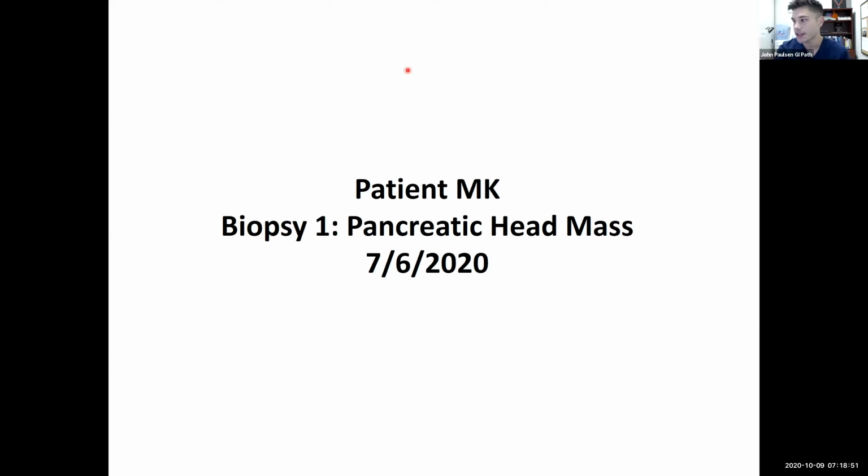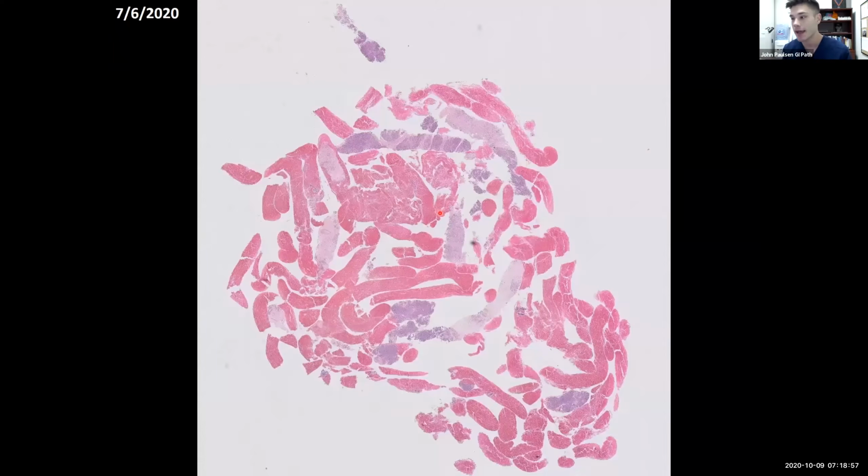Okay, good morning. I'm John. I'm glad to be here this morning to show some histology of this interesting case. So this is the first biopsy. This is the biopsy in its entirety.